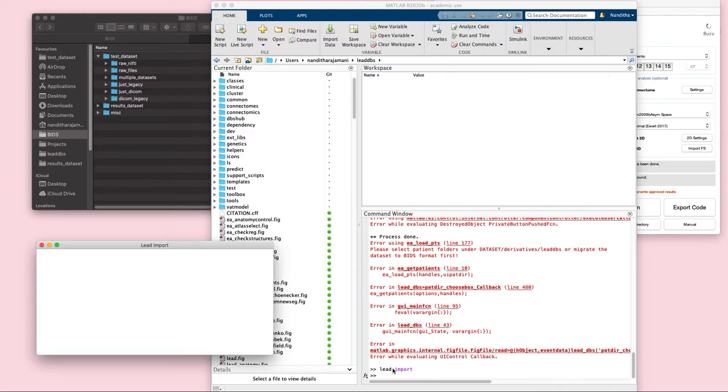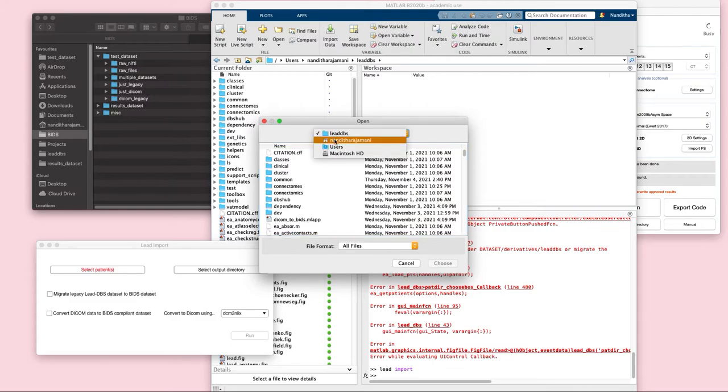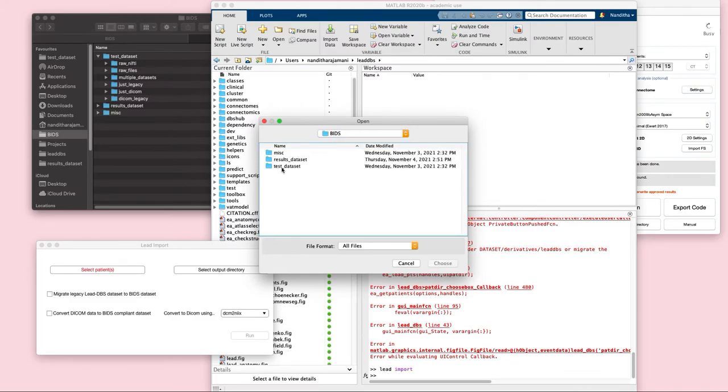go to the command line and you type lead import, and then you select your patients the same way that you would while loading it into the Lead-DBS GUI.